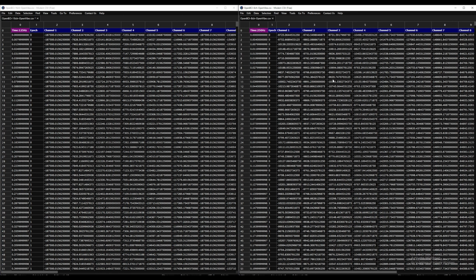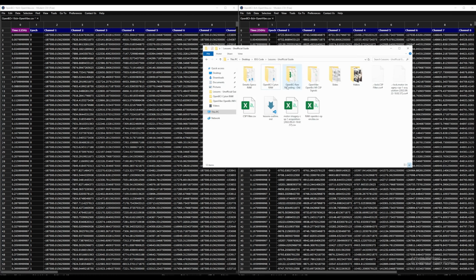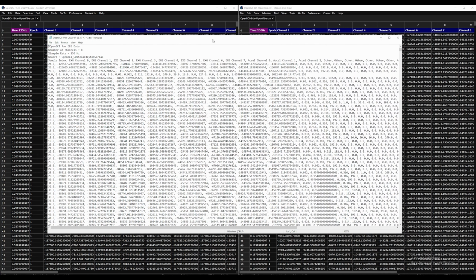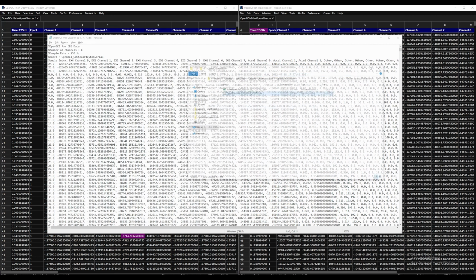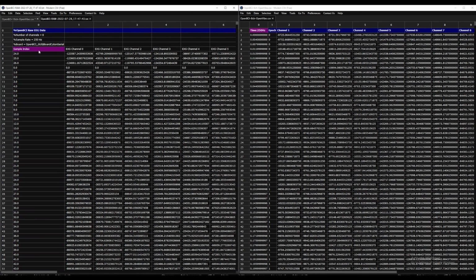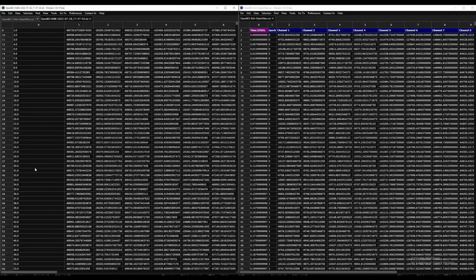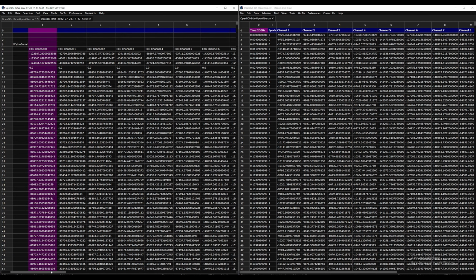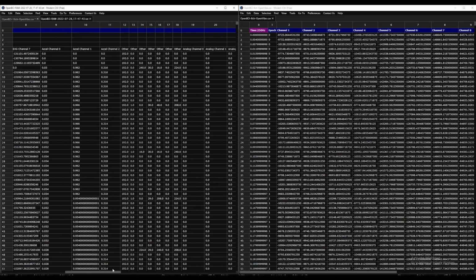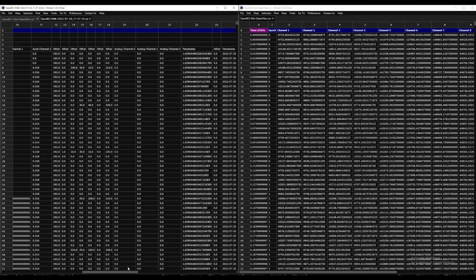And in reality, that's the nature of all EEG recordings. So if we were to record using OpenBCI's own GUI, the raw recording will be this text file, which is another CSV file. It has this header, which has details about the recording. Now, if I open it as a spreadsheet, you see that it has this sample index column, which is just numbers growing. And you have your channel data, which is the main part of the recording. And then you have all these extra columns from other sensors on the device.